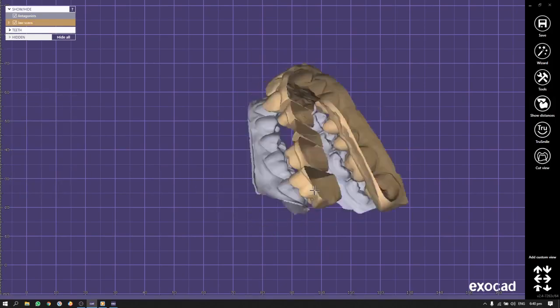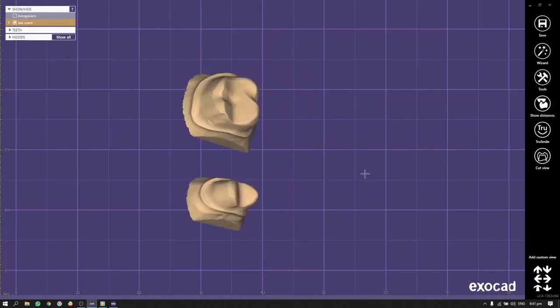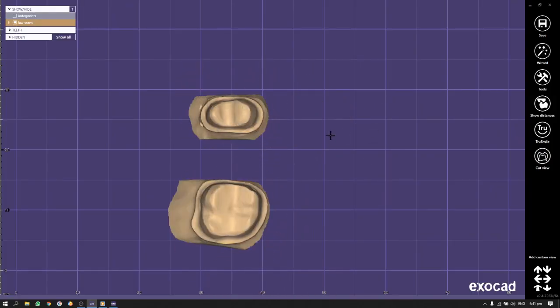This is the first step. Second, if I noticed that in the plaster model there is a void, I can close it with a wax, I can use a spray and then scan it. Or what can we do? We can leave it like that before the scanning. Also there is special wax for scanning, just not to spray it, but there is no need for it.